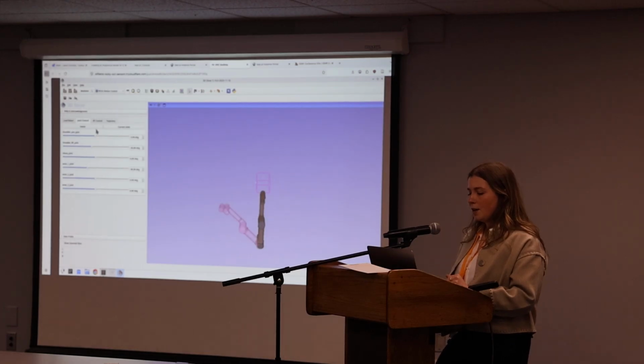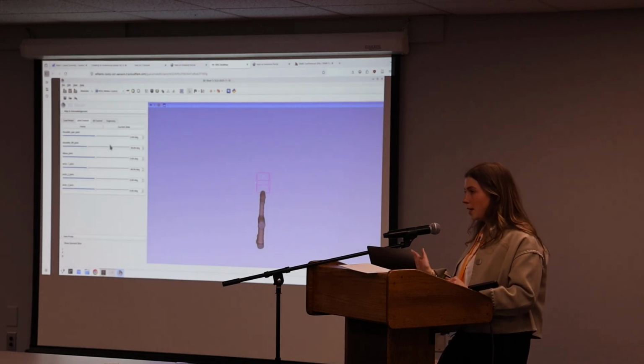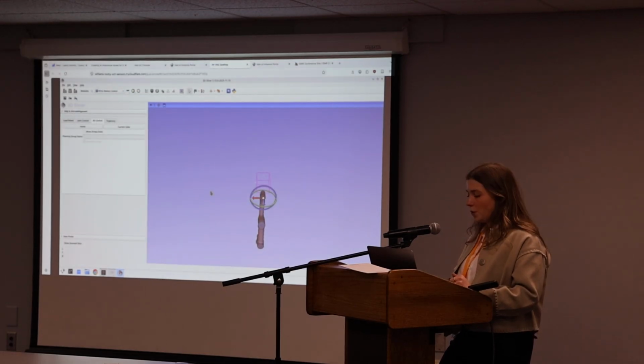You can also do home. That'll take you to the UR default home, or current state will take you to where the robot actually is. If you have this connected to a real robot, which we've tested it on, it will actually listen to where the encoders are saying the robot is, and you can start planning from there, which is probably safest. Next, you have this 3D control tab. In here, you can get that same 3D viewer, so you can drag the robot around.